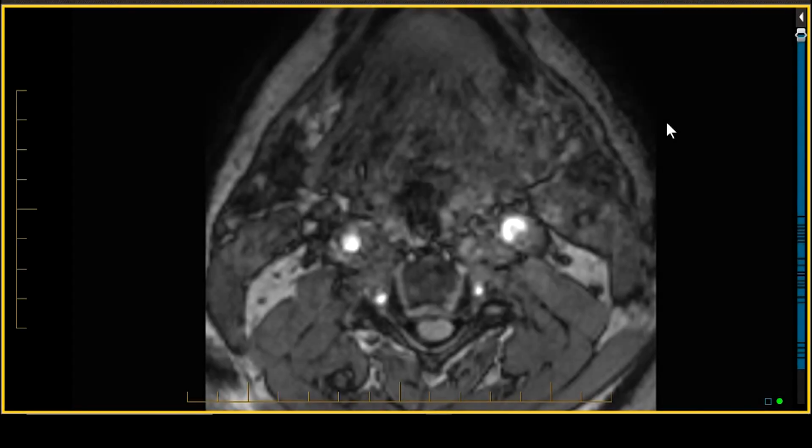Dr. P here, back with the parasympathetic ganglia and their relationship to cranial nerve 5. There are 4 of them in the head and neck, the ciliary, the pterygopalatine, the submandibular, and the otic. I want to look at an axial T1 thin section 1 millimeter high resolution MRI to show you the position of the 2 that are most important and intimate with the 5th nerve. I want to share with you the position of the submandibular ganglion and pterygopalatine ganglion.